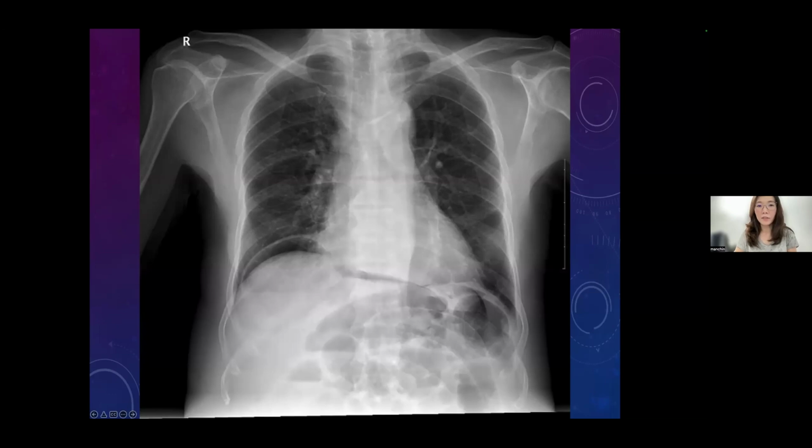Okay, so everyone, please remember this pneumoperitoneum. Even when you see the X-ray, it's sometimes very subtle, just a little line here that raises your suspicion. Correlate with clinical findings, such as the patient having intense, unexplained abdominal pain. If you're really not sure, go ahead and request a CT abdomen pelvis, which will give you a definite answer. The abdomen will be tender, guarded, and have rebound. Okay, let's go on.